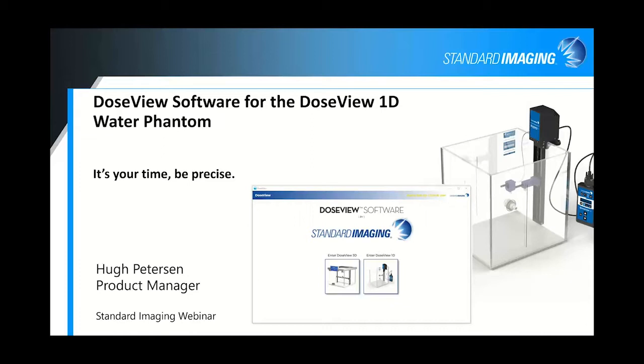You'll see on the screenshot here that we've integrated our 1D software into our DoseView software that used to cover strictly the DoseView 3D Phantom, our 3D water phantom. We've taken some of the functionality from the 3D side and incorporated it into our 1D software.